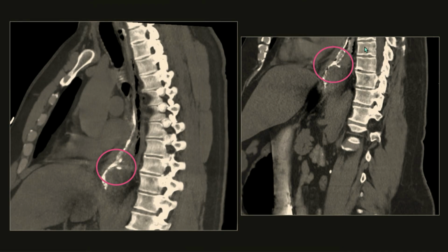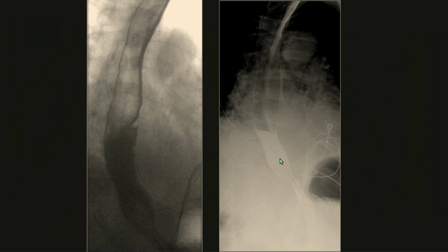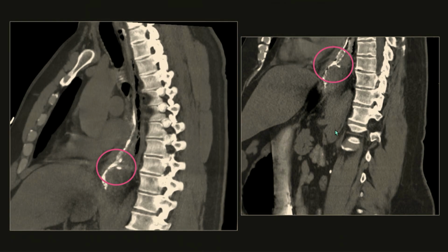And so we improvised a bit at the time and had the patient drink some oral contrast and do a limited CT and found that posterior, small, projecting, contained leak. So unsurprising that you can't find it on fluoroscopy, especially given that it's probably projecting posteriorly here. And then when you turn the patient sideways, there's too many overlapping structures to appreciate such a small leak.